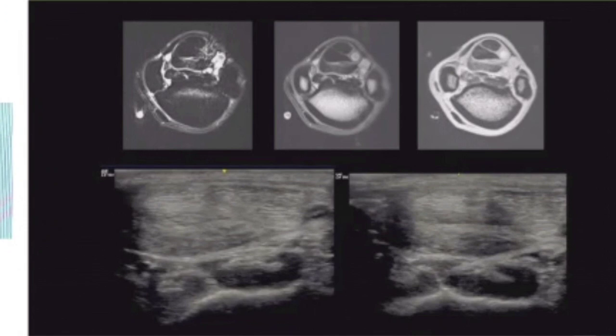The ligament can look almost completely normal, and almost all of the pathology in that proximal cannon area is associated with the bone. So the take-home point from this is, even if they block there, clinically you're suspicious of that, and you've ruled out any other confounding issues, a normal ultrasound doesn't mean that they don't have significant pathology at the suspensory ligament origin.